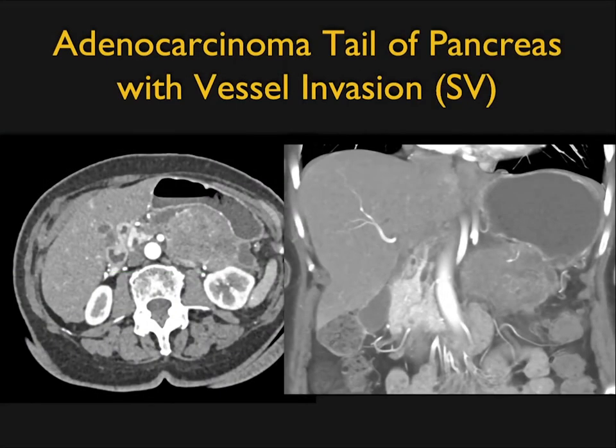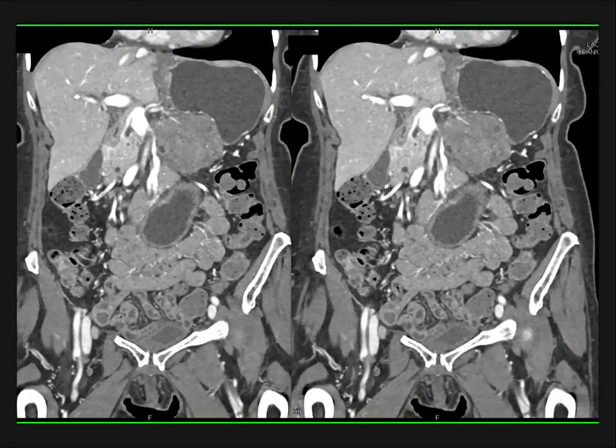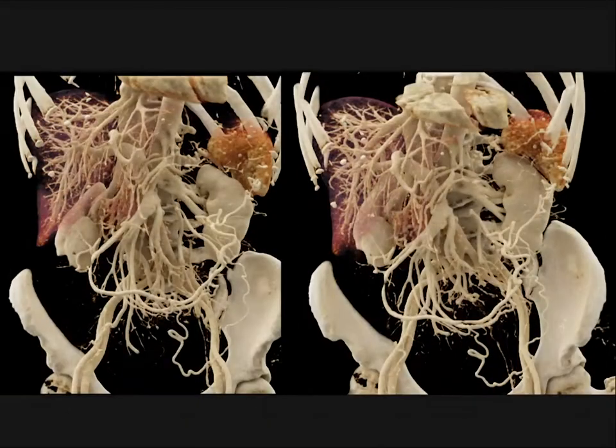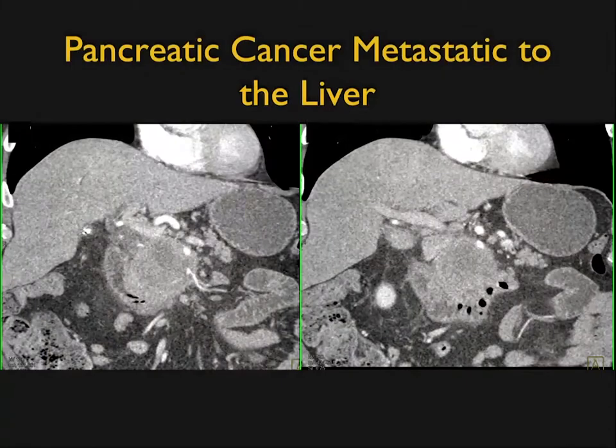Or in this example, same thing, large mass, increased vascularity, vessel encasement, growing posteriorly around branches of the SMV, branches of the patient's celiac. Here it is nicely, the cinematic rendering showing you the occlusion, particularly of splenic vein, the arterial involvement, the multiple collaterals, good demonstration of the liver vascular map, all very nicely shown in a range of 3D renderings. Now, one of the things also, of course, we look at is the liver.